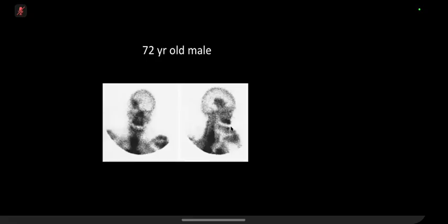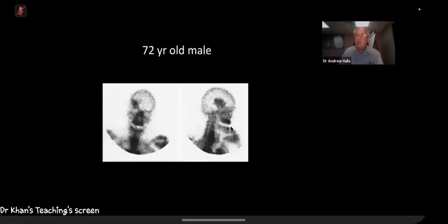You get hyperostosis with a meningioma. Yes, you do. That is a good idea. It could well be that. And you get calcification with a meningioma quite often. And anything in the body that can produce calcification, even if you have only a weeny bit of calcification, can show up on a bone scan.